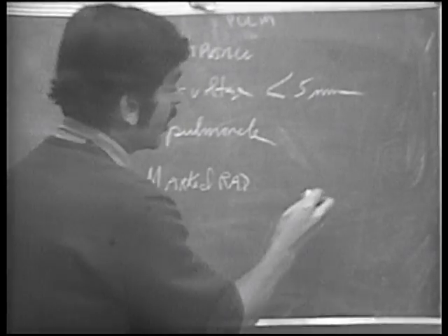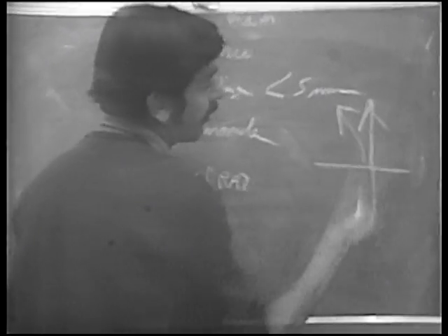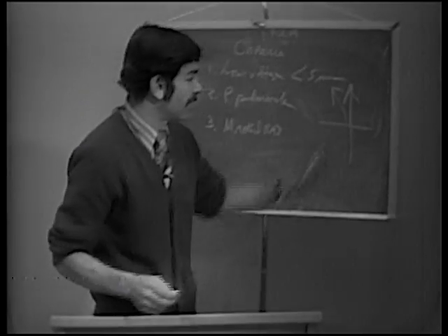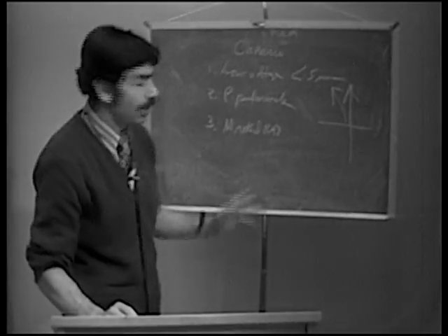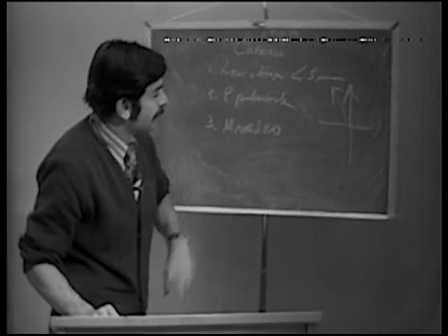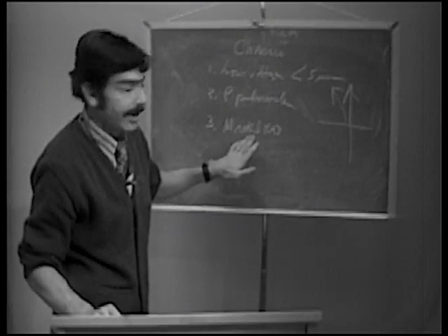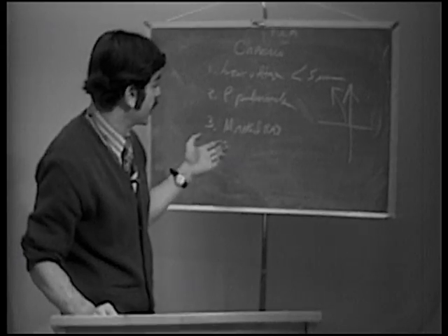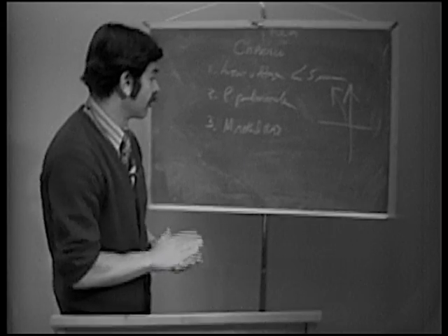These patients frequently have axes that go straight up, or they may go up into this quadrant. This is sort of an unusual axis, and anytime you see a patient with an unusual axis, it's worthwhile going back to see if they have the other criteria for pulmonary disease. Just because this is not present, however, that does not mean the patient does not have pulmonary disease. All understand that. It's just a helpful thing if it is present, but just because it isn't present doesn't exclude the diagnosis.